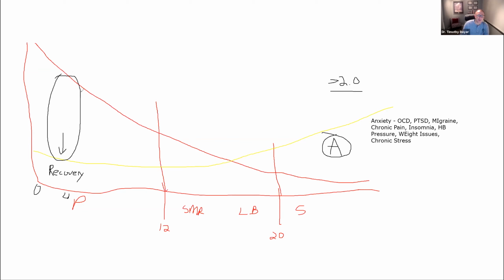If there's a real gap in this, sometimes this yellow line might start to come up a little bit and then come down and then go up. But I see this real pocket here at the beginning of the frequencies. If I saw this pocket in that yellow line going across, I know before I even look at it that the theta ratio is going to be super low. It's probably going to be less than 1.2, which, what does that tell me?